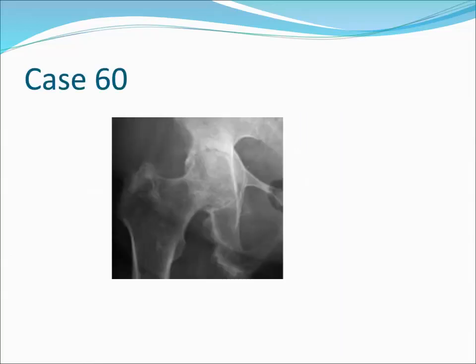Circumferential loss of joint space. Concentric, axial narrowing of the joint space is associated with tiny articular erosions, extensive fluffy enthesopathy along the ischium and greater trochanter, and fused sacroiliac joints. Mild protrusio acetabuli is also present. Ankylosing spondylitis.